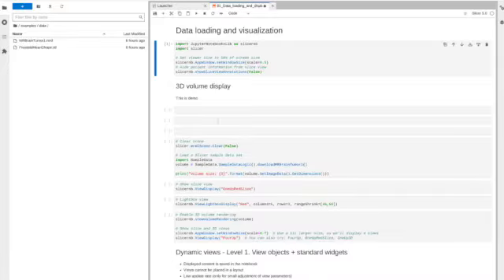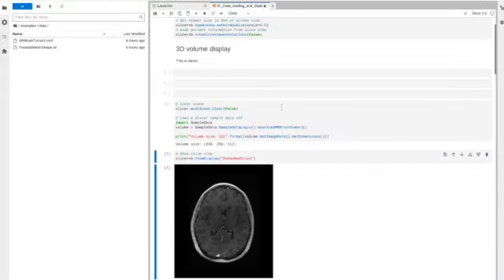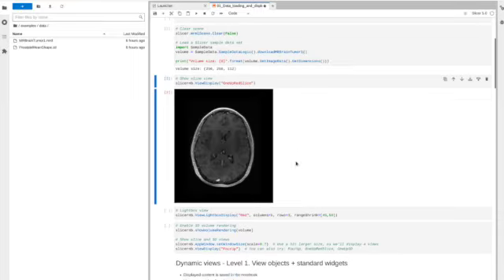So that was a setup, and then here's where it's actually going to load the NRRD file, and you'll see it's basically 256 images. And this will show you. Now with the MRIs, they're actually from 3 different angles. I forget the terms right now, but it'll be really clear in a second.